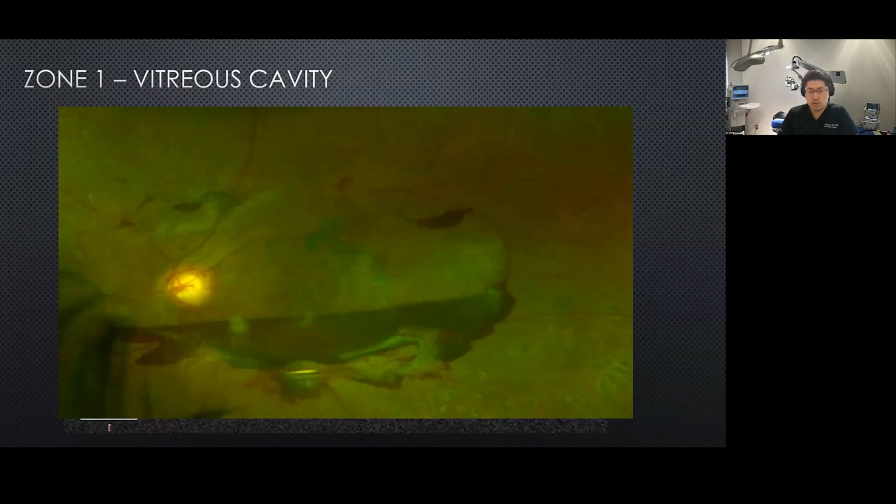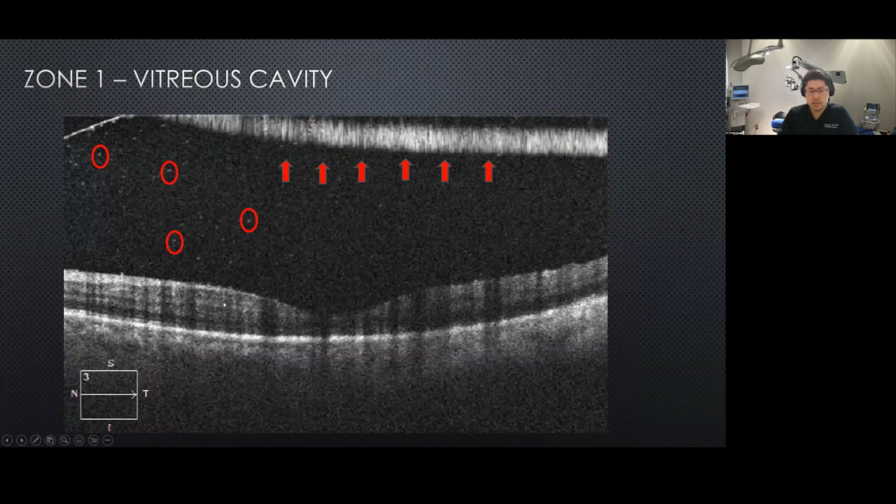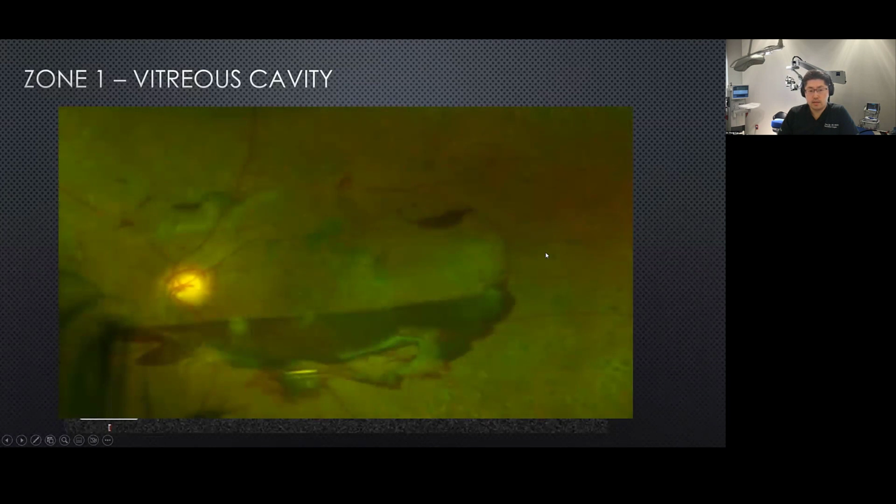And in the image of OCT, often the distance, even the thickness of the retina, is about 250, 300 microns. And so this distance between the hyaloid and macula is very, very narrow or small. And therefore, usually the detachment does not occur with it. And in this case, you have subhyaloid hemorrhage in a patient with proliferative diabetic retinopathy warranting surgical intervention.